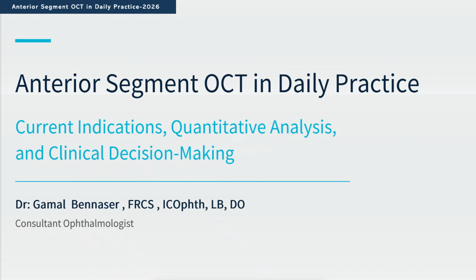Today's lecture is regarding the anterior segment OCT in daily practice and its clinical application. Before, we have spoken regarding the basic principles and the physical principles behind the anterior segment OCT. Today we'll complete our journey in this regard and speak about its application in the clinical field, the quantitative analysis and the clinical decision making.